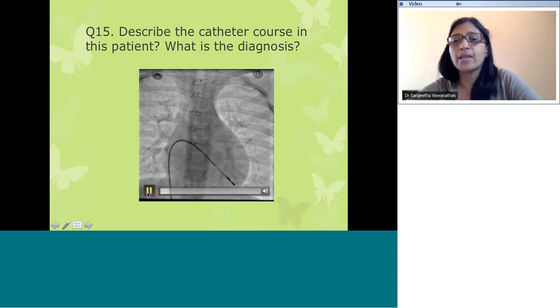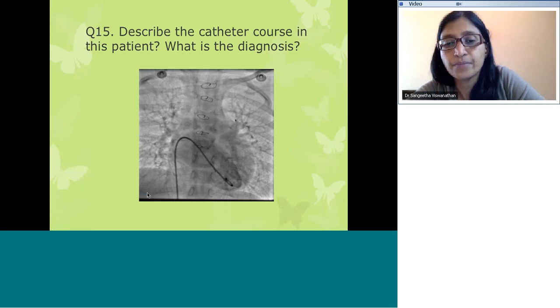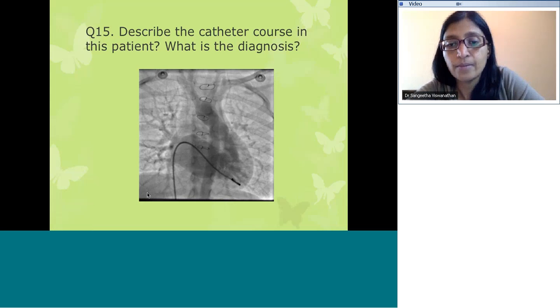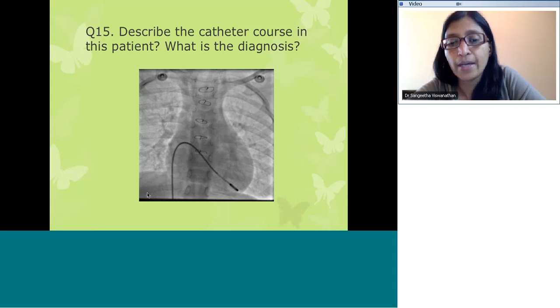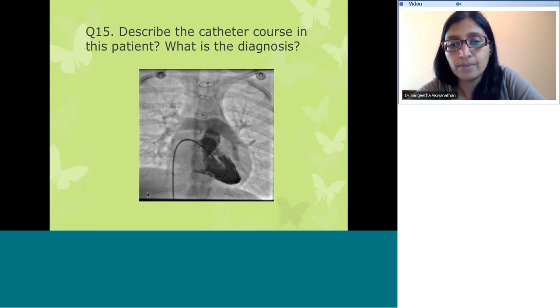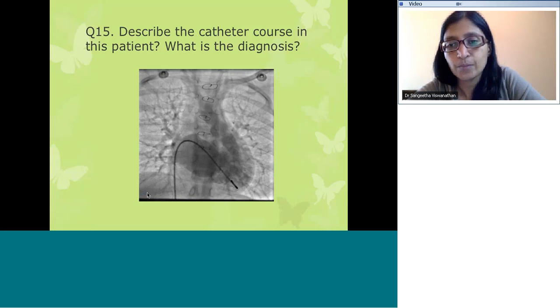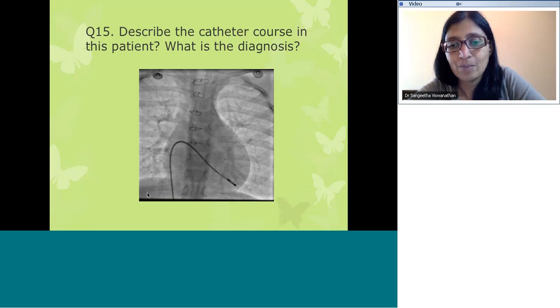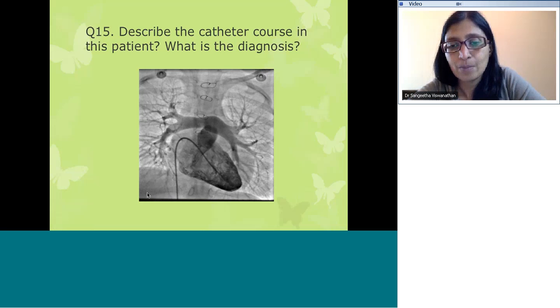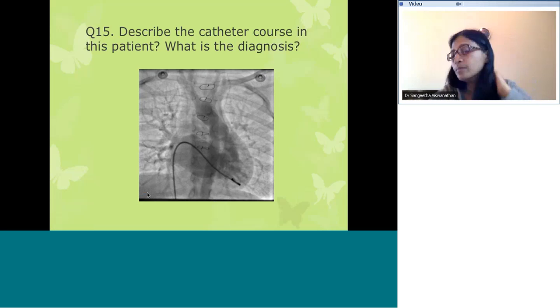Okay, describe the catheter course in this patient. And what is the diagnosis? Any answers, guys?